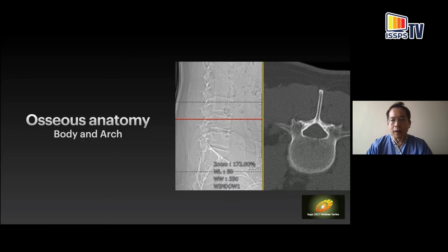So on this axial image, we can see the spinous process. We can also see the laminae of the lumbar spine and then the transverse processes as they come down on both sides. This is the L4 spinal canal, the bony margins of the spinal canal, and then the vertebral body. You can see the erector spinae muscles, and they're defined by fatty strands within the intermuscular as well as the intramuscular spaces. Note the orientation of the pedicles in an oblique projection.